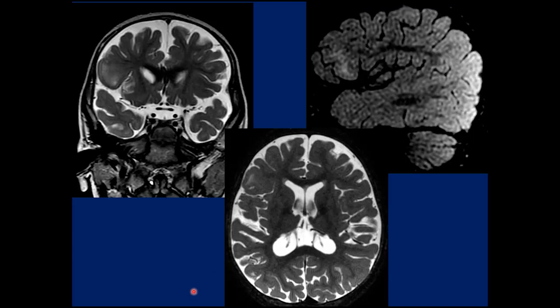Here we have the preoperative MRI. We can see that there is an area of the right frontal lobe where the differentiation between the white matter and the gray matter is poor. You can see the opposite side where the white matter is in black and the gray matter is in gray. It's very clear over here. So this image is very suggestive of type 2 cortical dysplasia.